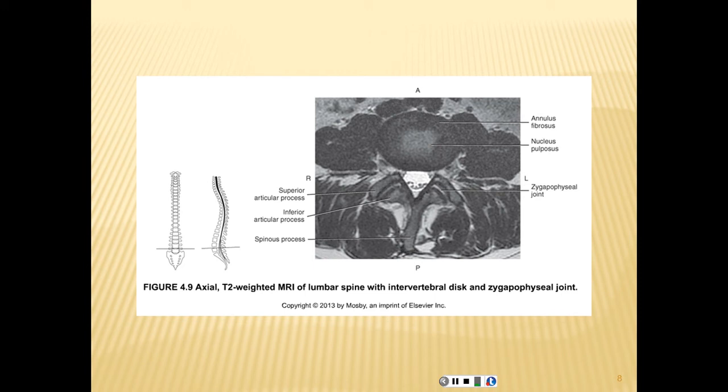You can look inside of the vertebral column, and you see the axons. I'm sorry. Yeah, you see the axon ending.